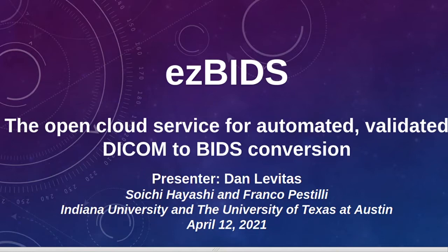BIDS compliant data sets are also able to be run on what's known as BIDS apps. These are software packages that are very streamlined because they only accept BIDS compliant data. So it makes them very easy to use.